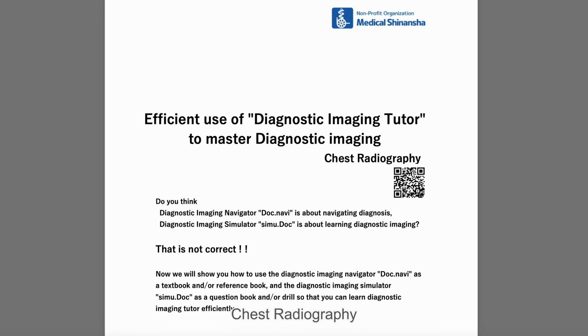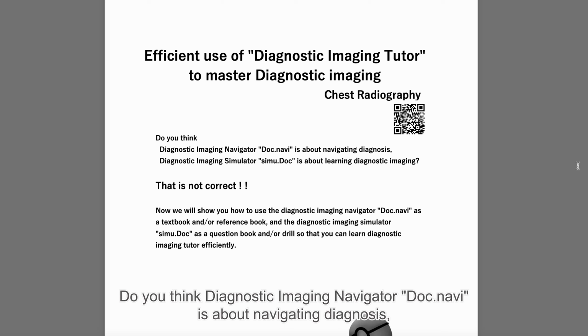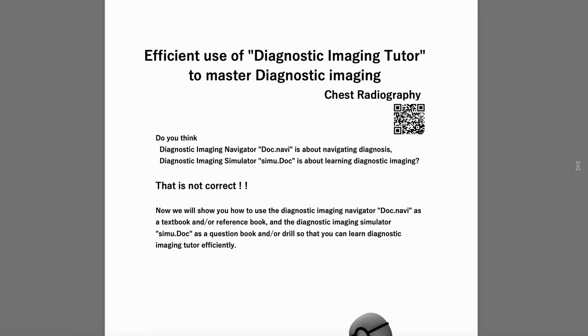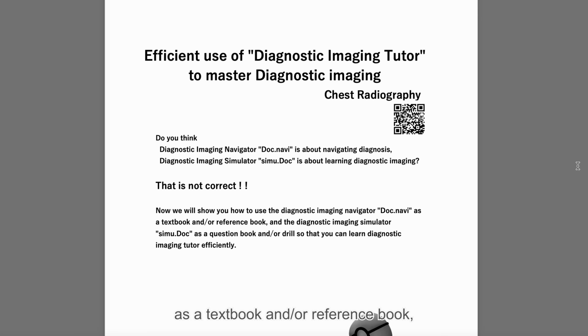Efficient use of the Diagnostic Imaging Tutor to master diagnostic imaging. Chest radiography. Do you think the Diagnostic Imaging Navigator, Doc.navi, is about navigating diagnosis, and the Diagnostic Imaging Simulator, simu.Doc, is about learning diagnostic imaging? That is not correct. Now we will show you how to use the Diagnostic Imaging Navigator, Doc.navi, as a textbook and/or reference book, and the Diagnostic Imaging Simulator, simu.Doc, as a question book and/or drill, so that you can learn the Diagnostic Imaging Tutor efficiently.